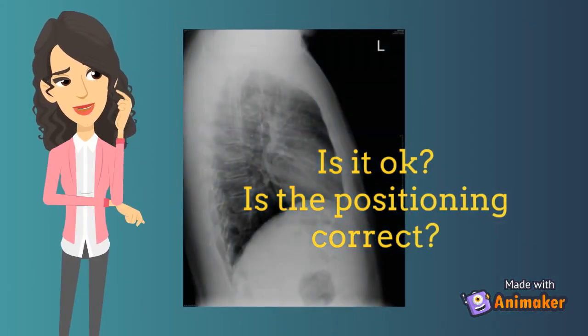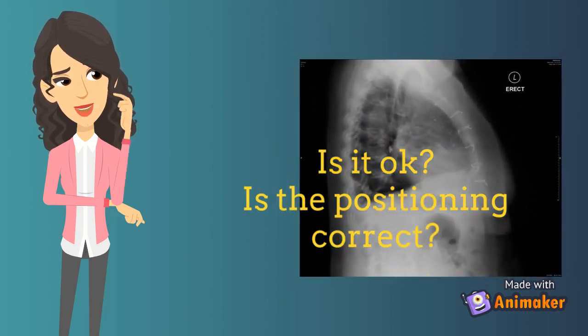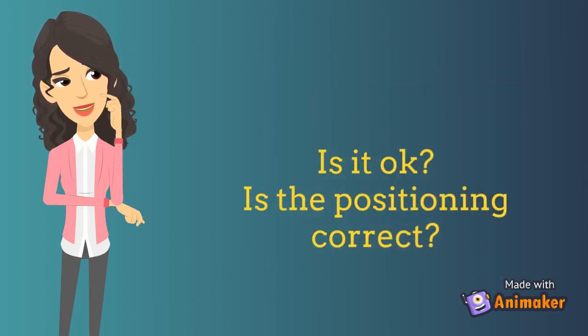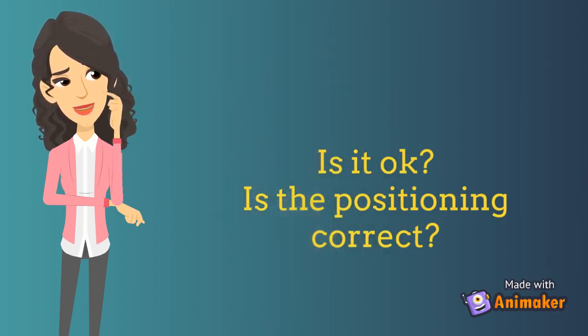As a radiographer, your duty is not just finished after you press the exposure button. You need to evaluate your output image before you send it to the requesting clinician. In this stage, you need to assess the quality of your image. Let's focus your assessment on the positioning aspect. Does the radiographic image deliver the right positioning criteria to best demonstrate the diagnostic value?